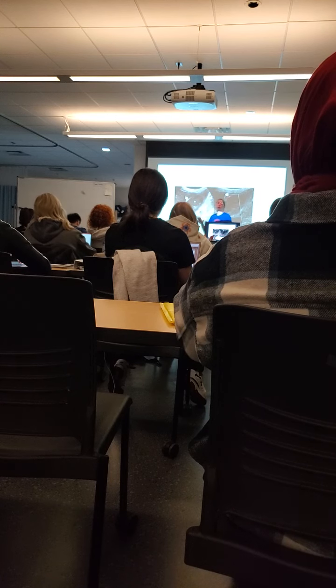Okay, so this doesn't look like much. It's kind of a sludge-filled gallbladder, but there's no stones in it, and we still have that thickened wall. So ignore the sludge. We don't care about the sludge, but we are looking at the thickened wall, and there's no stones associated with this. Here's another one. So no stones, but we're seeing this thickened gallbladder wall. So how do we know if this is edema or hyperemia? Put your color on it. You got it.